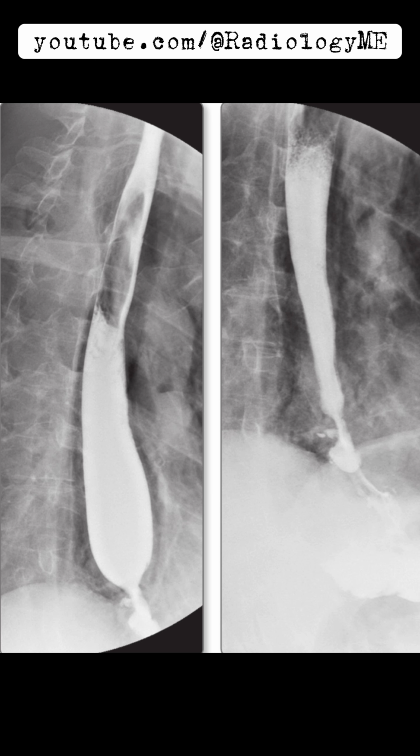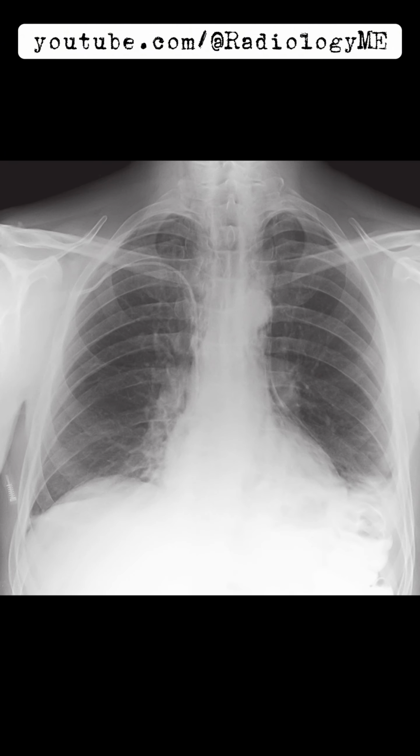At this stage, we've got pneumomediastinum, pneumoperitoneum, and clear extravasation of contrast from the esophagus. All these findings point towards an esophageal perforation. The distribution of free gas supports the diagnosis, and I'd say this is likely iatrogenic, given the appearance of the narrowing and the absence of classic signs of spontaneous perforation, like a history of vomiting.